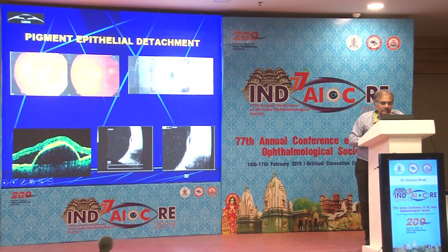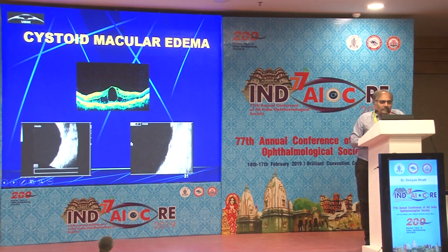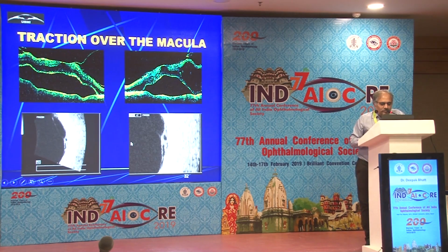We know what the status is, but here you don't require an ultrasound. Actually, OCT is much superior. But I'll tell you where it is useful. Even cystoid macular edema can be seen very well on a 20 megahertz probe. See the traction on OCT and see the 20 megahertz picture. Very, very similar. Okay, but if there's clear media, all this is nonsense.